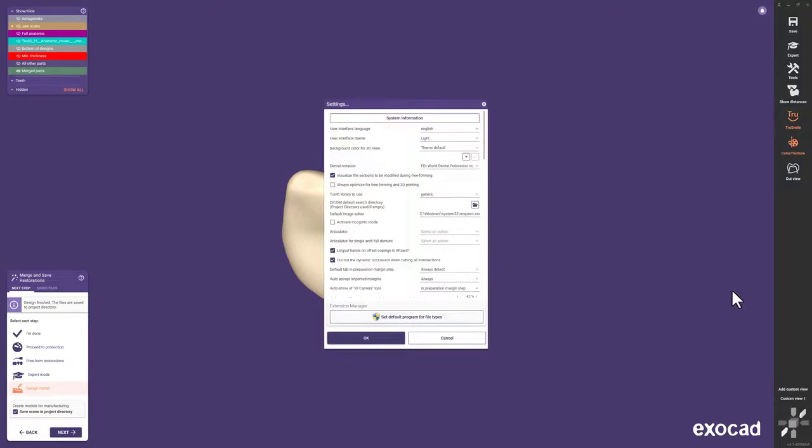If you prefer advanced editing software over Paint, you can also set a professional app as default in our updated settings menu.